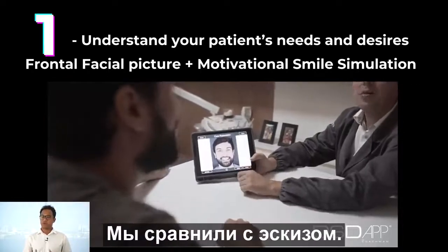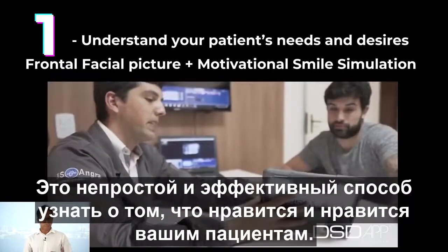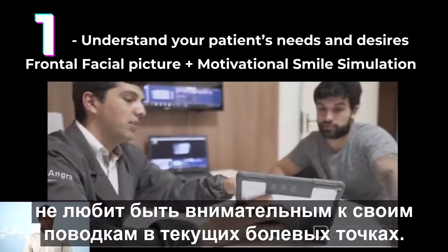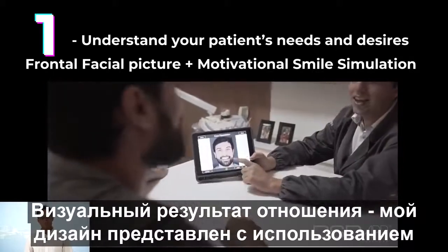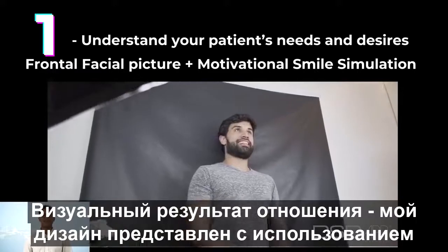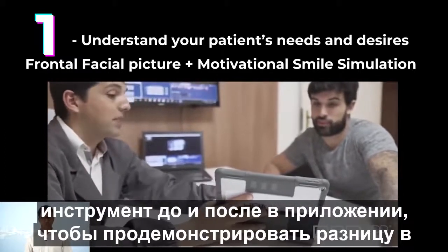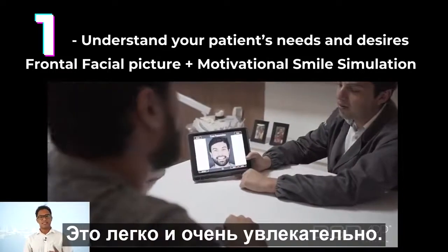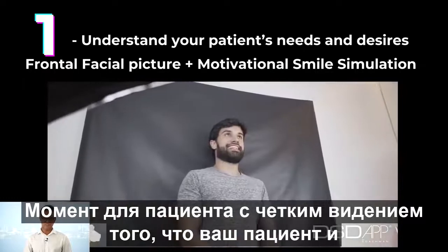Oftentimes, we compare it to a sketch. It is an easy and effective way to learn about your patient's likes and dislikes, pay attention to their wishes and current pain points. The visual outcome of the motivational smile design is presented using the before and after tool in the app to demonstrate the difference in the facial aesthetics. It's an easy and very exciting moment for the patient.